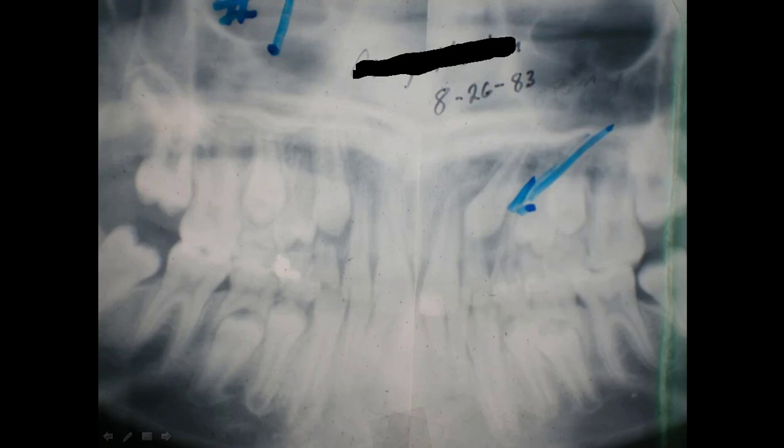Now, and then you put your finger up in the roof of this young man's mouth and kind of palpate around the back. Even then you could tell that the cuspid was on the lingual side. Now today we've got a lot more complicated x-rays and see this thing, you can tell exactly where it is. But we could figure out back then where it is. I had no problem figuring that out and knowing where it was. And so we got it in.